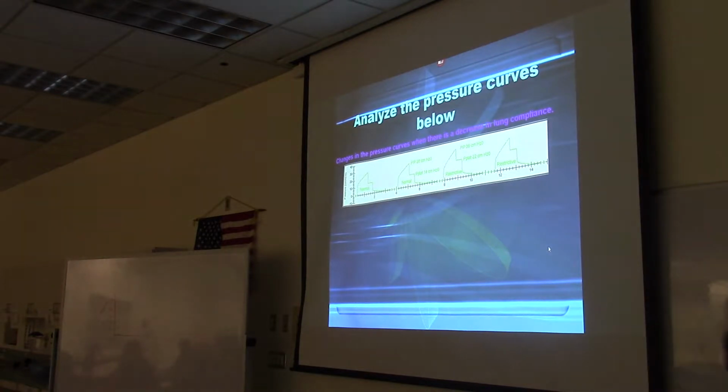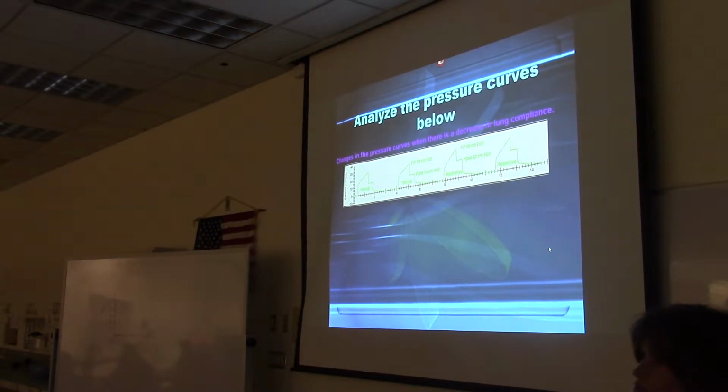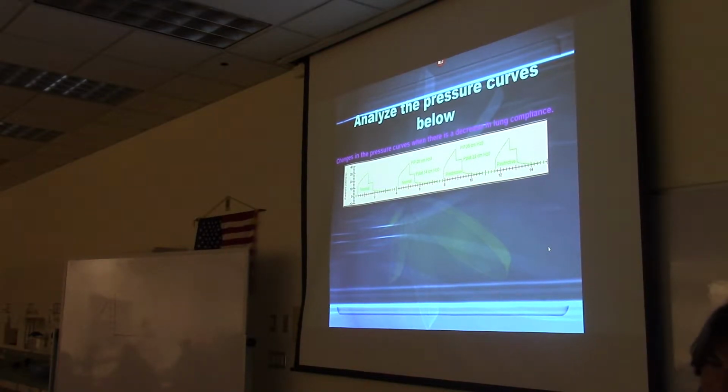Right, so this is a pressure time graphic, and when the curve goes up, that's just pressure building as the air is being pushed into the lungs. And then on exhalation, the pressure goes down, so it's air coming back out of the lungs. So there's a couple things that it's showing you on here.